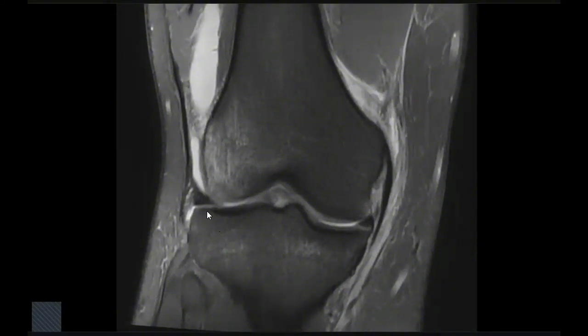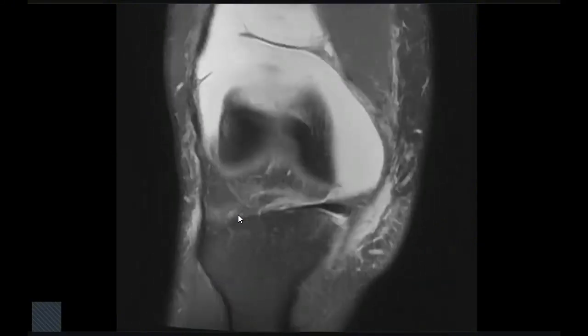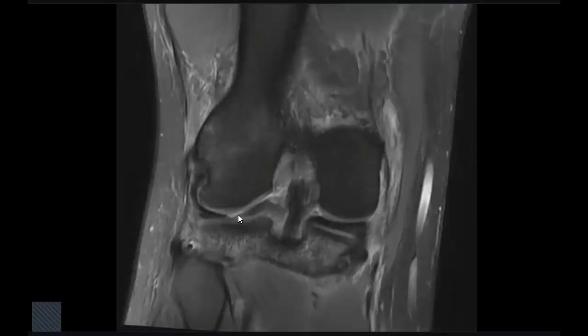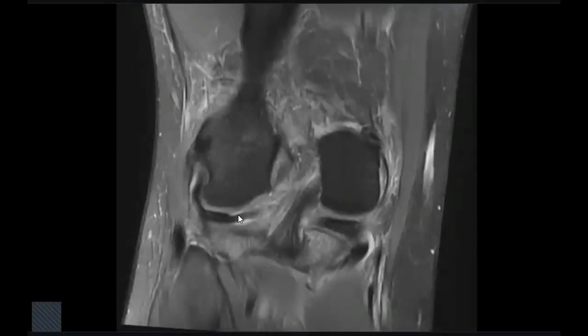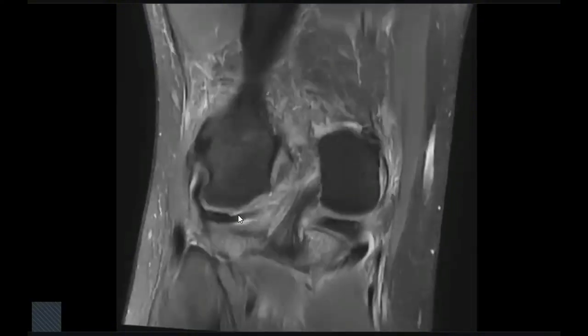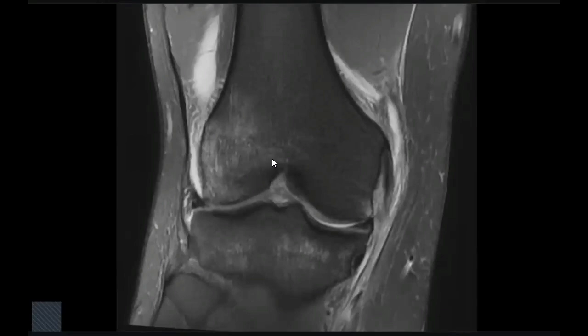The horns of the lateral meniscus and the medial meniscus appear normal in this view. And this is the PCL, I think it's normal. So in this view, I can see suspected bone contusions.